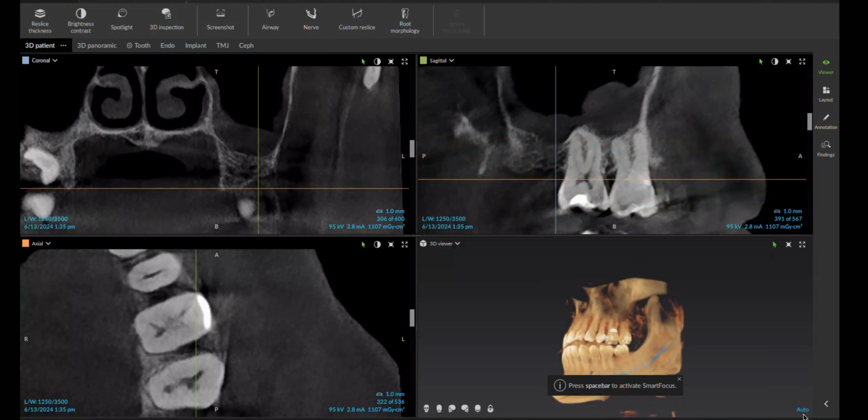The patient's chief complaint was pain in the area of tooth 15 in the upper right. And you had astutely taken a CBCT, as your two-dimensional radiographic methods and your clinical evaluations were inconclusive, which is not atypical. As we know, the CAT scan is not a tool that we use as a first-line defense, but more of an adjunct if and when our normal tools and technology don't give us what we need. So we still have to follow the ALARA or ALADA principle in minimizing radiation when we can.